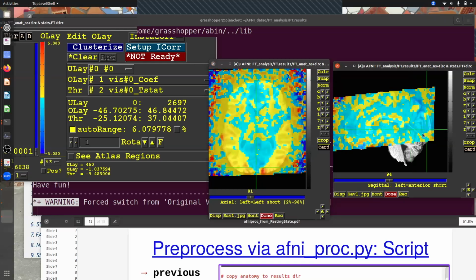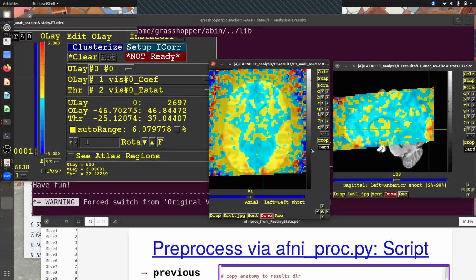We know that the visual cortex is kind of involved. If I go here, part of the visual cortex is also red, so that's good. So we've done a scientific measurement and we've seen the largest numbers are outside the brain. That should probably worry us a little bit, because we would probably expect to see where those up and down boxcars were. We saw those aligning well with our stimulus inside the brain, and everywhere else it looked very garbagey. So why is this happening and what can we do about it?